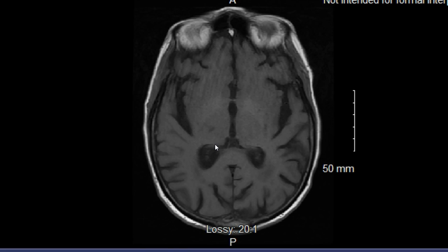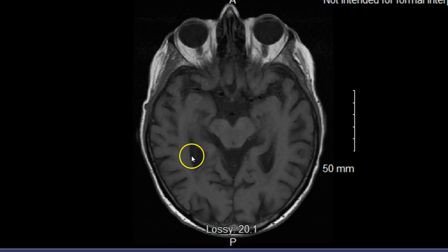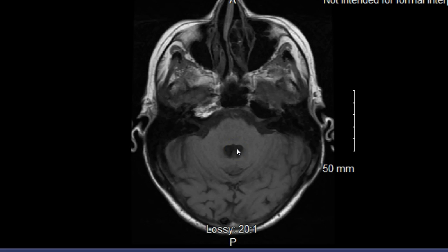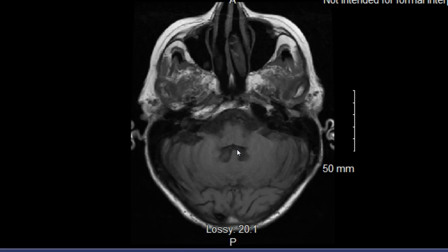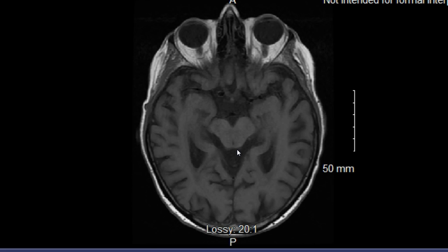Subsequently, you can see that. You can very nicely visualize those structures accordingly. You can see the temporal horn pretty well of the lateral ventricle here versus the third ventricle here. And then subsequently, carrying on to the fourth ventricle. So, like I said before, great visualization in MRI, just so much potential. And whether we're looking at it in CT versus MRI, just so much depth of information.